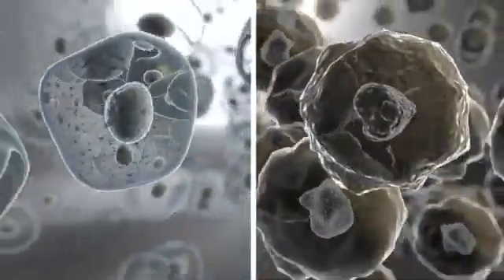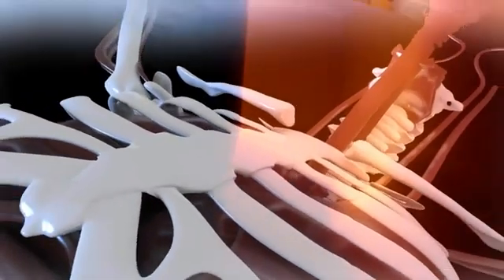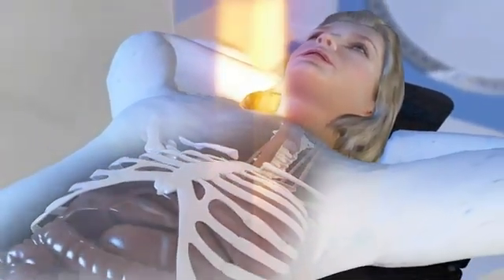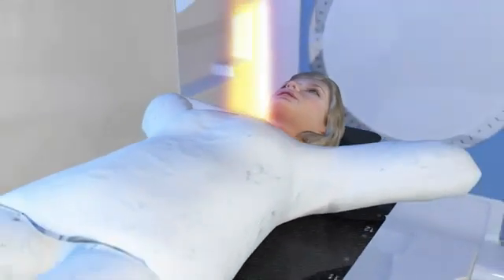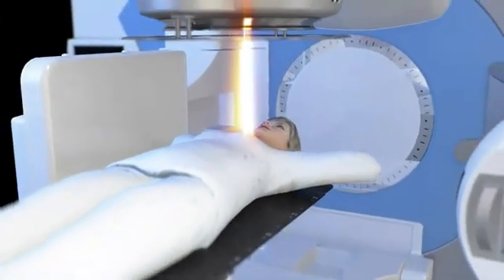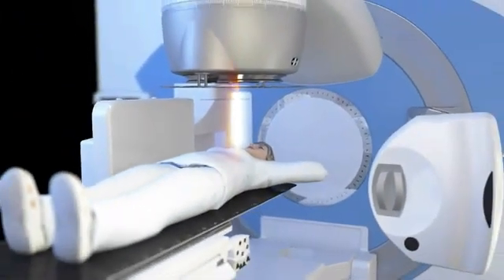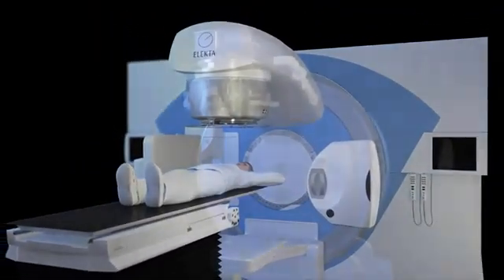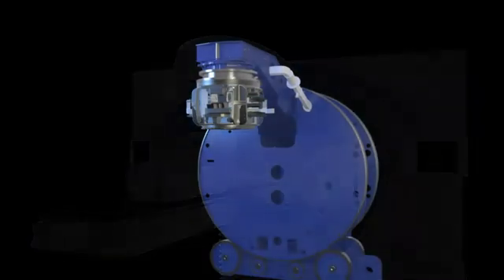Successful radiation therapy depends on the ability of the linear accelerator, or Linac, to deliver a tumoricidal dose of radiation to the tumor, while ensuring minimal radiation of normal tissue. The Linac accurately produces, monitors, controls, and conforms the radiation beam to the planned target.